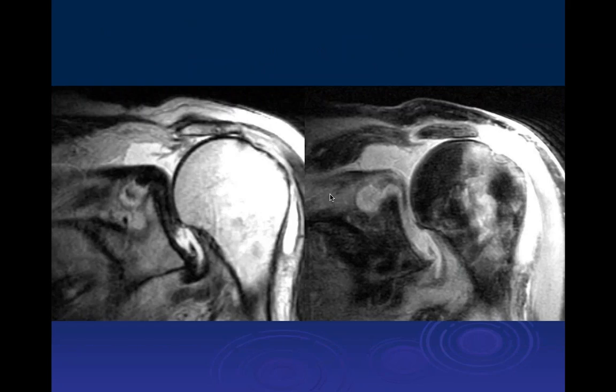Okay. Now, the other thing that you look for, which is actually quite uncommon, but important to recognize. Jonah, what do you think of this case? Sure. So we've got a couple coronal images, T2 probably, and PDFS. So we've got a very high position of the humeral head, and it looks like a full thickness tear of supraspinatus. Now we see this hypo-intense structure kind of drooping into the glenohumeral joint space, and I'd be concerned that that's actually just the supraspinatus tendon kind of flipped down there. Which is what it is.